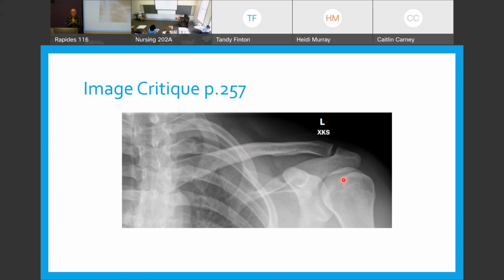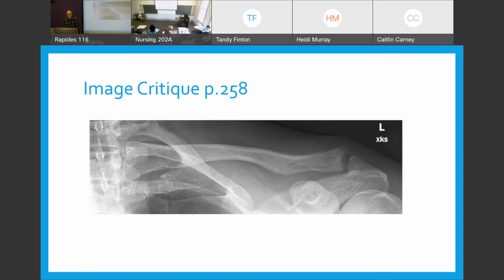It's the one unique thing about this particular projection. Somebody want to help her? It's what? Expiration. Remember, that was the only one they said exhale. All the others are what? Inhale. Yeah. All right.